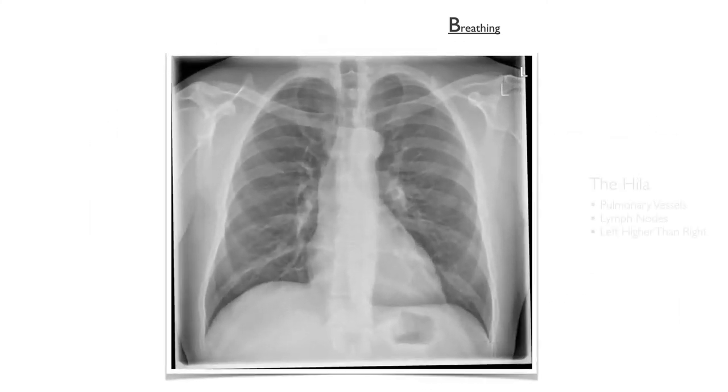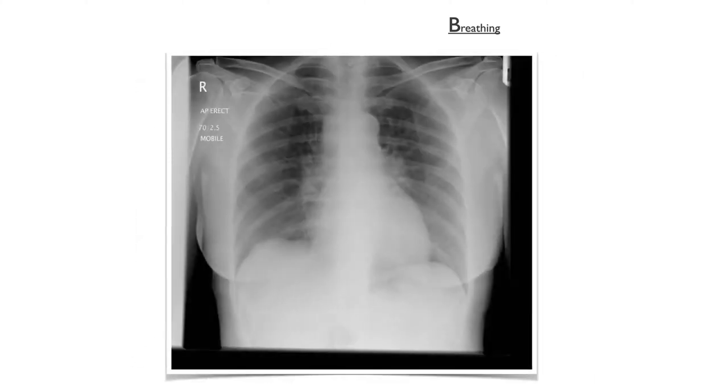After reviewing the lung zones, look at the hilar. The hilar contain pulmonary vessels and lymph nodes. They may become more prominent in some diseases. Bilateral hilar lymphadenopathy is a common presentation seen in exams. If you are presented with this, your differentials should include sarcoidosis, tuberculosis, and lymphoma.